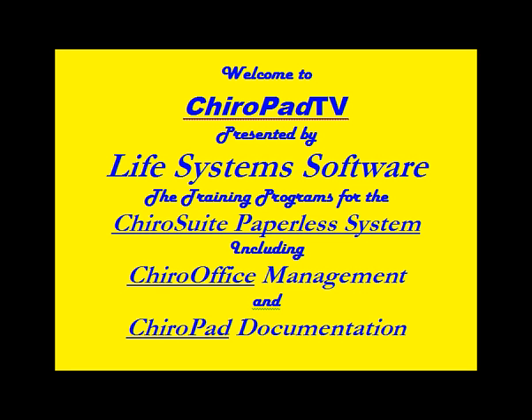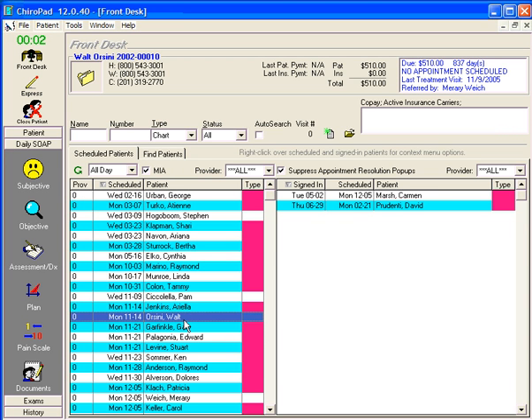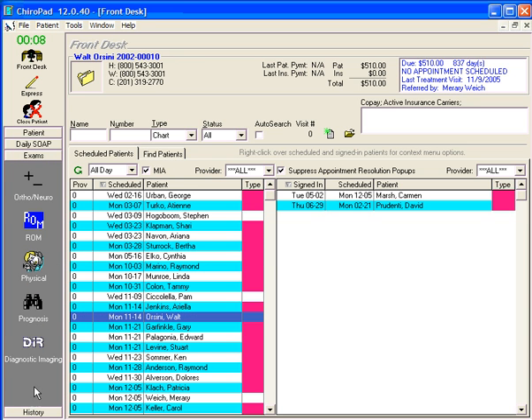It is with great pleasure that we provide you with this segment of our video training series for the ChiroSuite program. This presentation is going to focus on the diagnostic imaging report. First, make sure that Chiropad is open and select a patient. Double-click on that patient's name and that opens their account. Then come to the Exams button, click on it, and then click on Diagnostic Imaging.